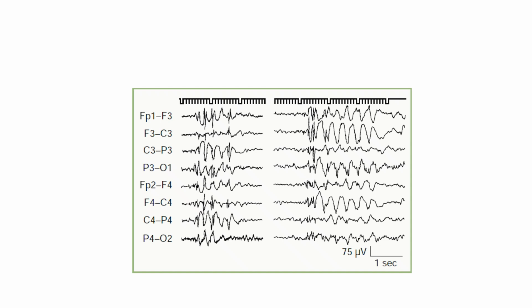When these bursts are brief, lasting only a few seconds, the patient experiences those occasional absence attacks mentioned in the figure text, brief staring spells with a sudden pause in consciousness. When these synchronous bursts become more prolonged, unmodulated, or faster, they can easily destabilize the entire cortex, cascading into the generalized tonic-clonic seizures that this patient primarily experiences.